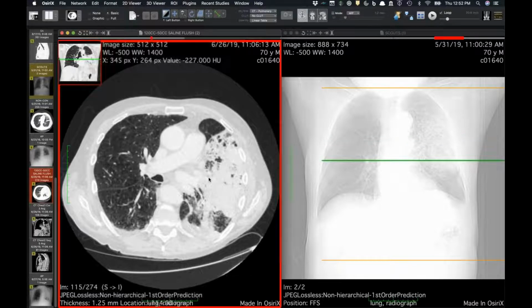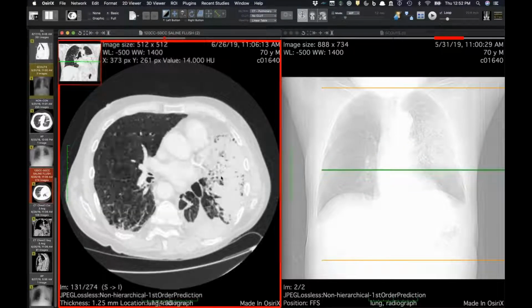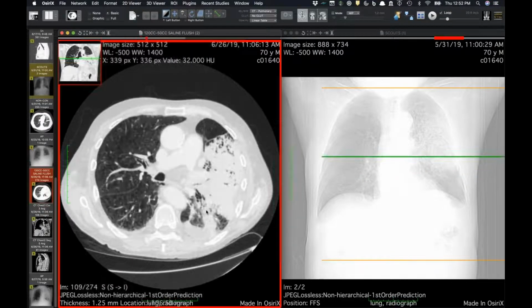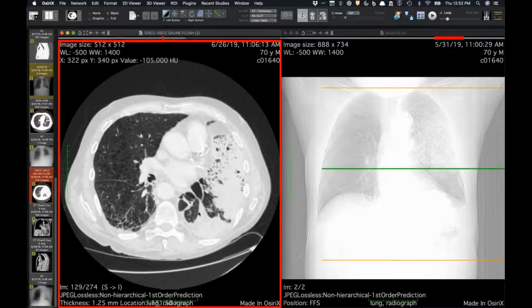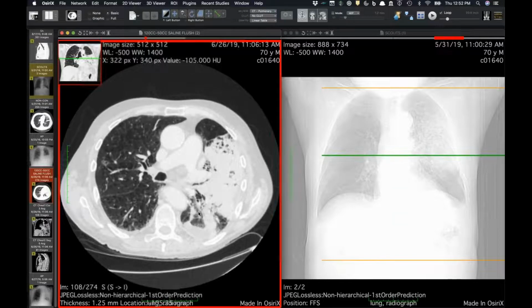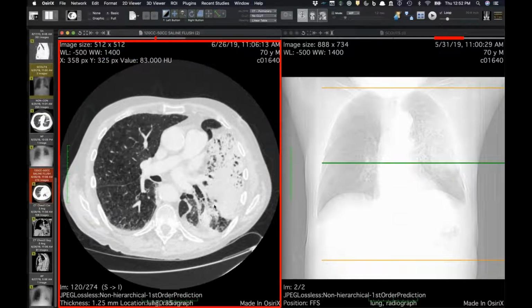I know they did do a pexy to the diaphragm and to the epicardial fat. I think there is a ligament, and I think that's why you still have aerated lung there. That's why the swirl didn't complete itself and the left upper lobe didn't end up completely above the right. It was stuck by the ligament, remained in place back there posteriorly.